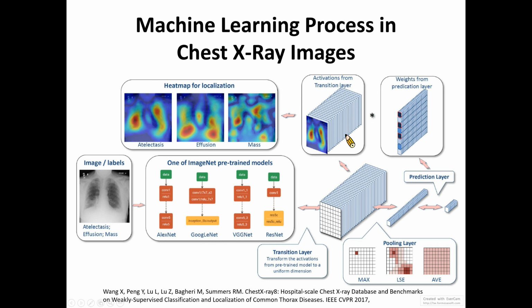we can train the network. Here there is also something else we need to do, some pre-processing, because the network's input images are 227 by 227 by 3, but the new data images are not in this dimension. So we need to resize the input images according to our neural network model.